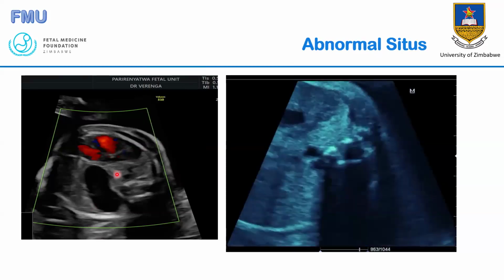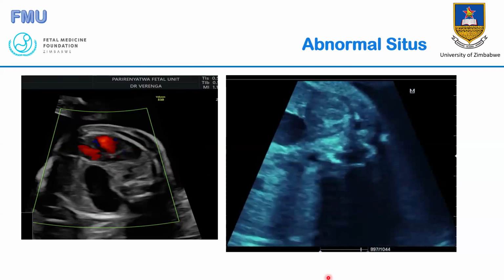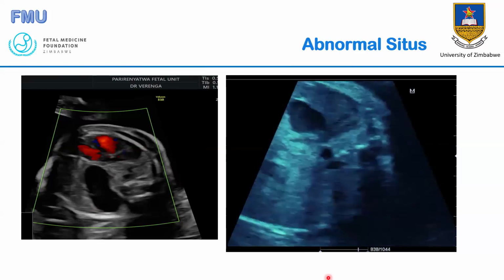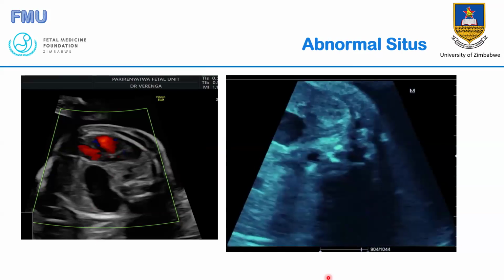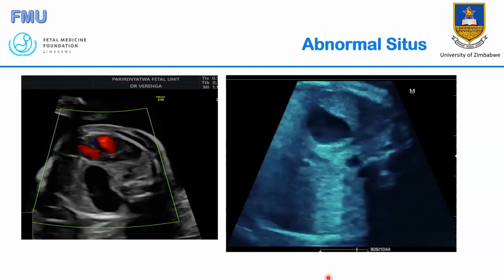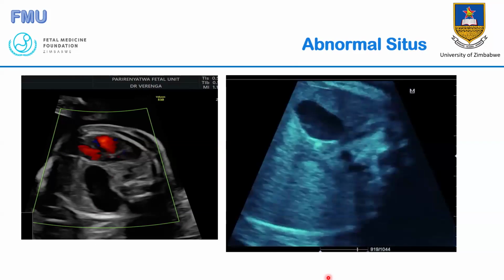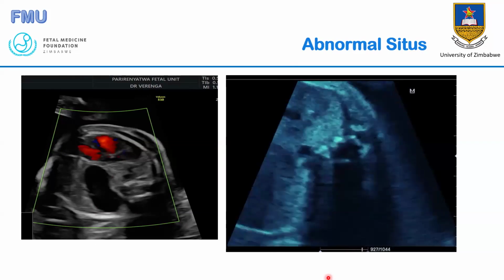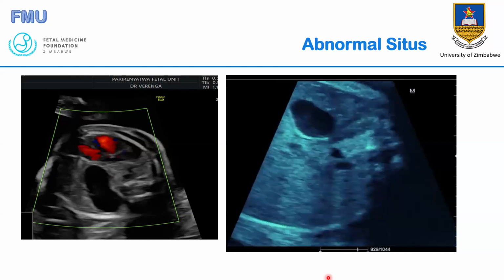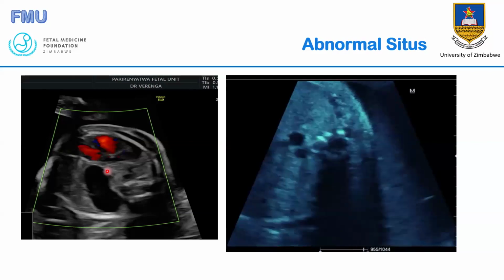Let's look at this heart now. At this image, what is wrong? Just on that image we are looking at there. I'm sorry, it's not the base of the image, but there's something which is not right on that image when you look at it. What is wrong there? The clever one, you can start with the one on the left side. What's wrong with the two images?